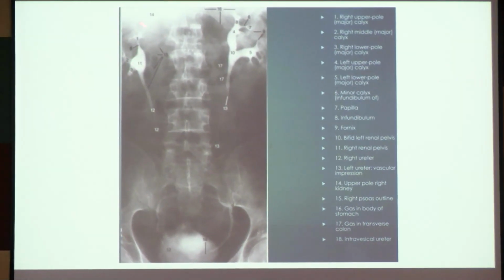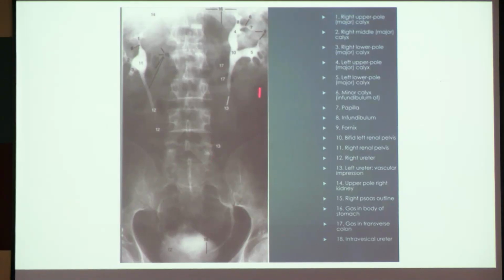So again we are basically going to look at the normal ureteral anatomy. We already know the upper calyx, the middle calyx and the lower calyx, pelvis, and thereafter this is the narrow line which actually enters and ultimately forms the ureter. When are we visualizing this particular ureter in the IVP film? We will see in the later sections. It is almost around 15 minutes from the time we are injecting the dye. Till that point of time we are not going to visualize the ureter at all.